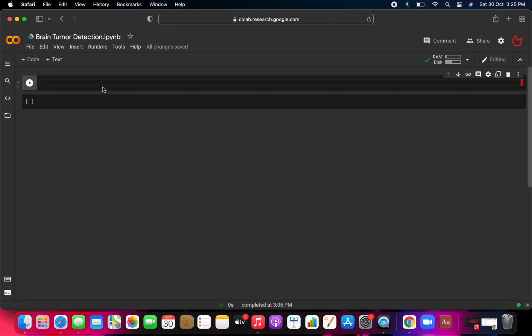We will use PyTorch as the deep learning library, and we will use a CNN, convolutional neural network. We will build the CNN from scratch, with all the layers. We will not use any pre-trained model in this video. So let's get started.